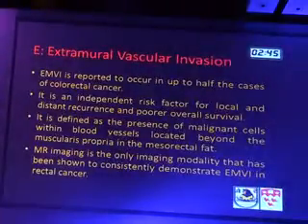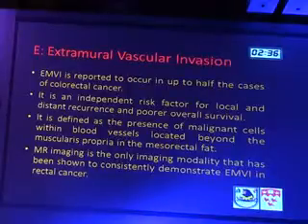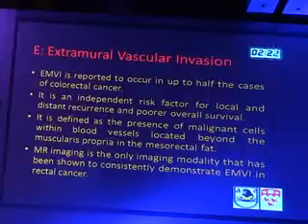Let's jump into the extramural vascular invasion. What is the EMVI? It occurs usually in half of the cases. It's very important. Usually we call it EMVI whenever we have a T3 tumor or above. Never T1 or T2 tumors cause EMVI. Can we see it easily by MRI? Yes, we can see it easily. Usually the vessel distends and it has an irregular outline and is filled by tumor, even without contrast.